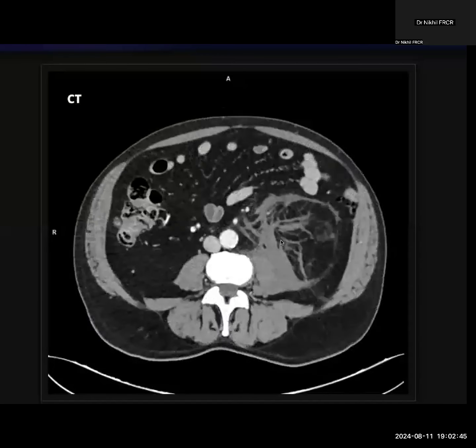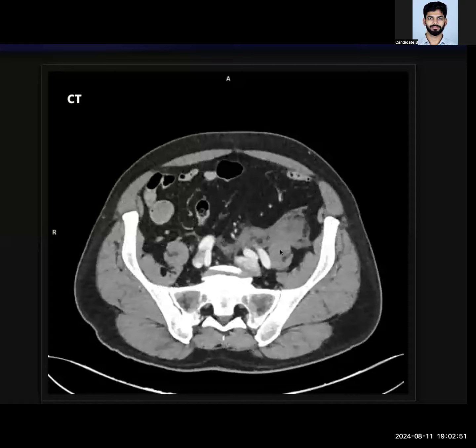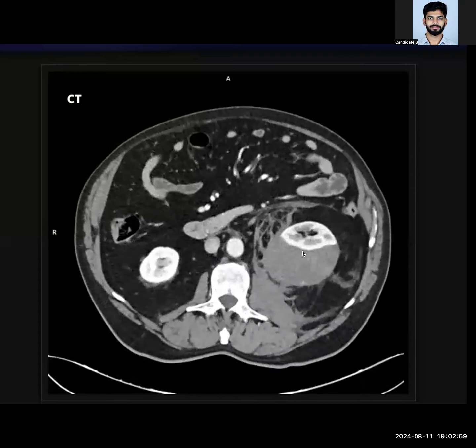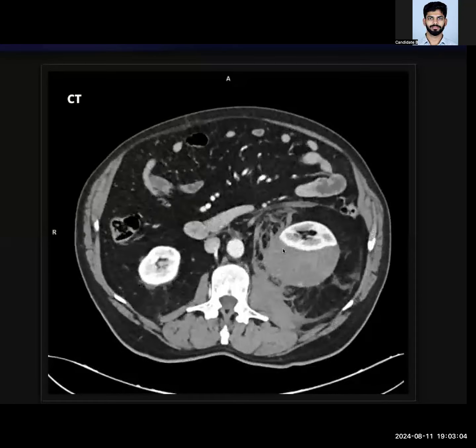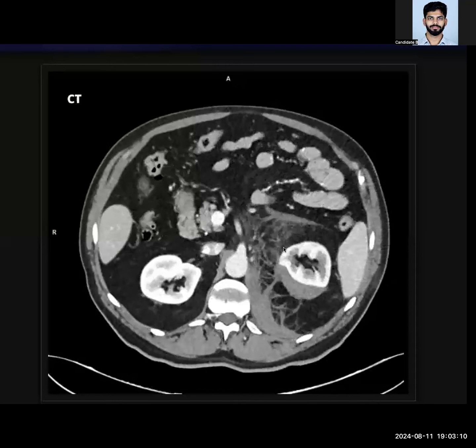Okay. So provided are post contrast axial sections of abdomen and pelvis of the same patient. I'm quickly coming to the area of interest. I can see a perinephric hematoma, which is pushing the kidney anterolaterally. I can see a contrast blush in the lower pole perinephric location.